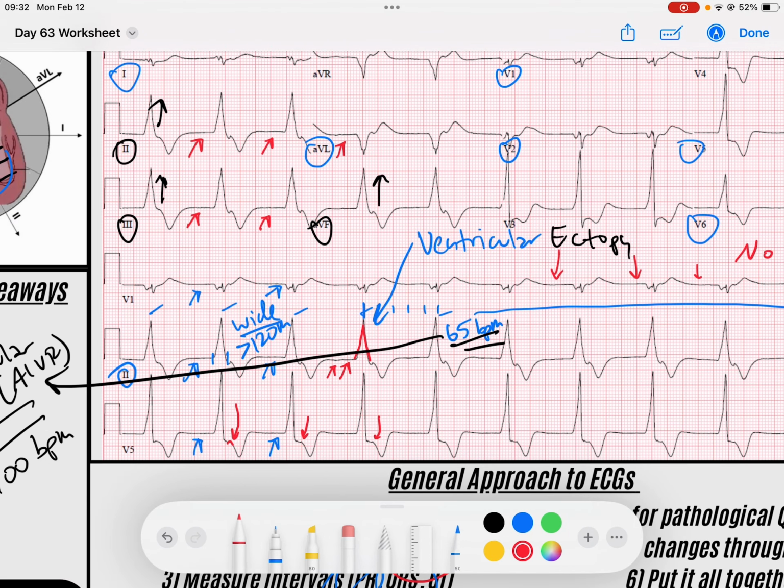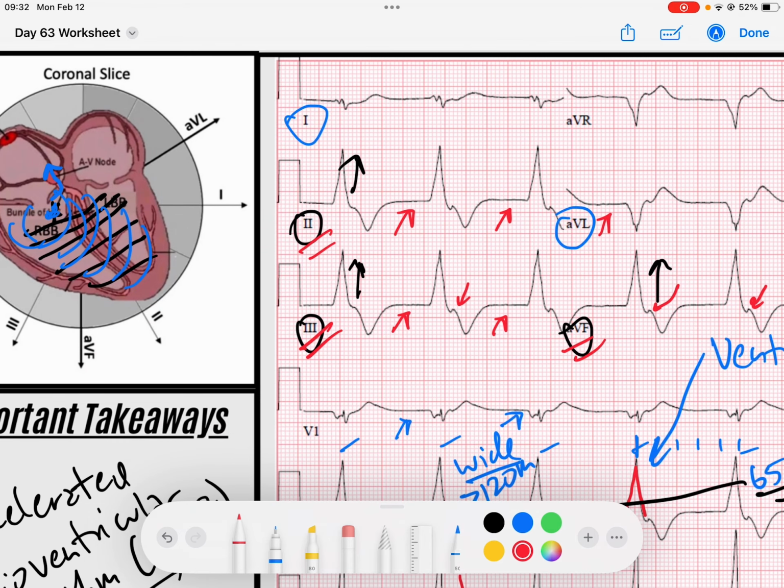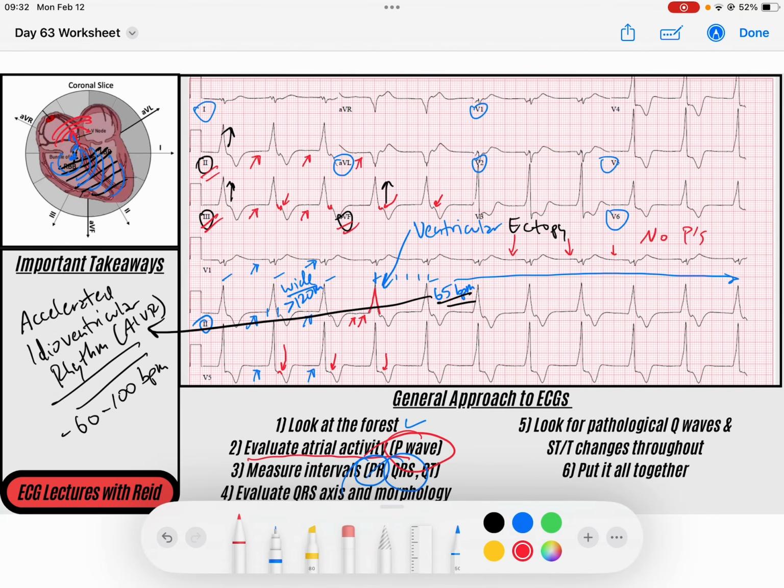You can see it a little bit better in these inferior leads here. You can see this little bump, and P waves are usually sharp, and so there is a chance that that could be a retrograde P wave, as the AV node is conducting signal back, right? And we would expect these retrograde P waves to be negative deflections, which maybe is what this represents. So kind of plus or minus, but at the end of the day, what we know is that there is a sinus node standstill, right?